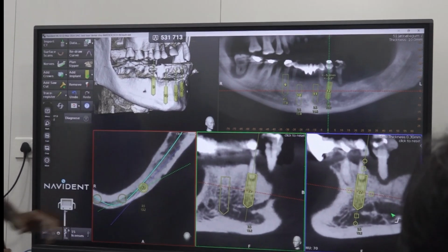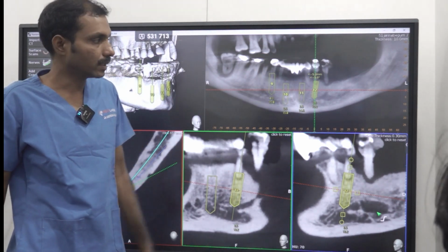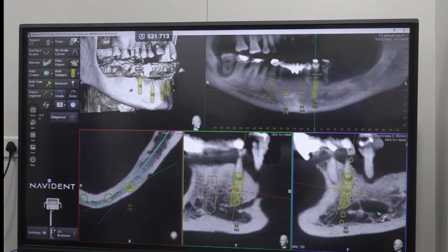We usually think that the mental foramen stops at 5, but sometimes it comes anteriorly as a loop or an extension of the canal, incisive canal. That may be the source of some paresthesia or bleeding during surgery, right?